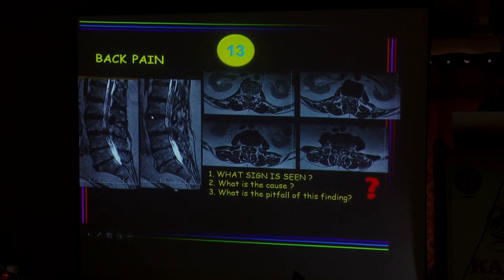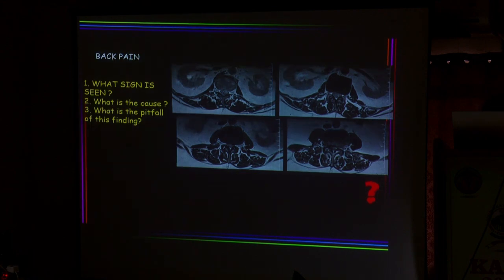Okay, this is called the redundant nerve root sign or redundant nerve root appearance. You can see multiple elongated tortuous nerve roots, and this basically occurs due to severe spinal canal compromise, and you can see clumping of the cauda equina rootlets. To identify the redundant nerve root, you have to look at the axial images. The main pitfall is that this should not be confused with arachnoiditis.